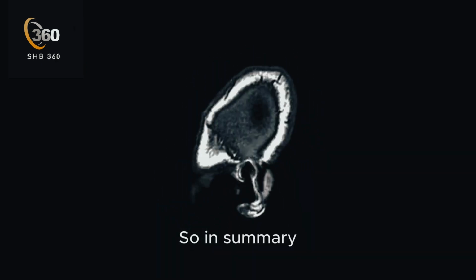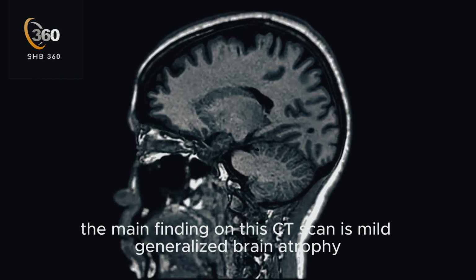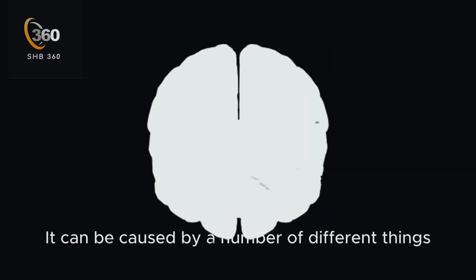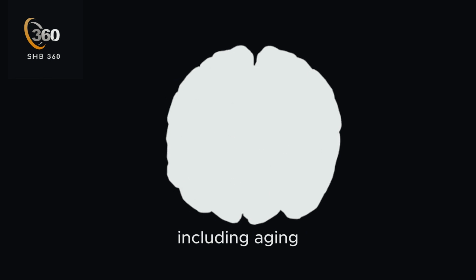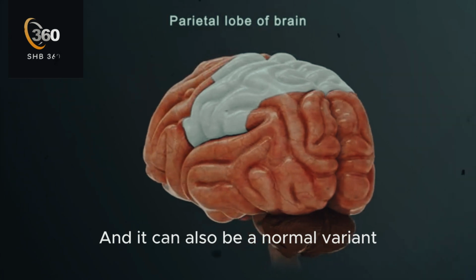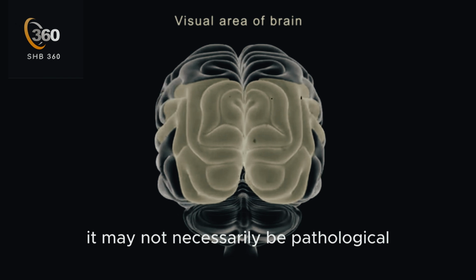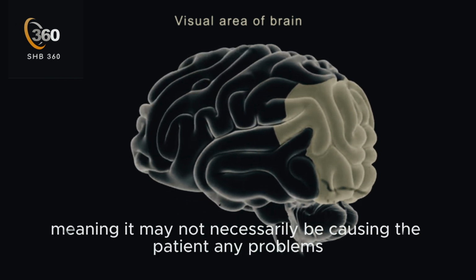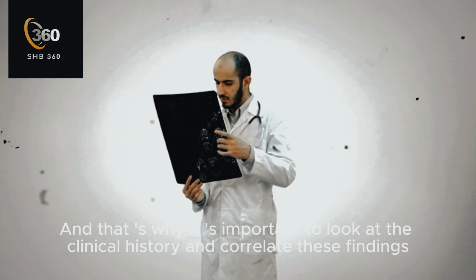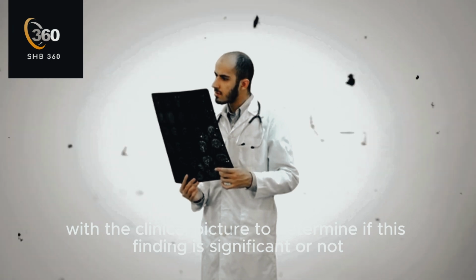So, in summary, the main finding on this CT scan is mild generalized brain atrophy. Brain atrophy is where there is loss of brain tissue. It can be caused by a number of different things, including aging, and it can also be a normal variant. So while this is an abnormal finding, it may not necessarily be pathological, meaning it may not necessarily be causing the patient any problems. And that's why it's important to look at the clinical history and correlate these findings with the clinical picture to determine if this finding is significant or not.